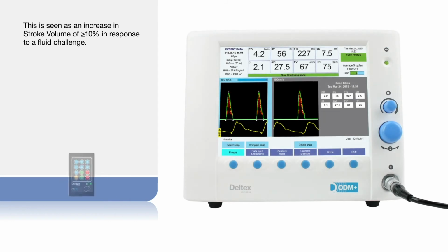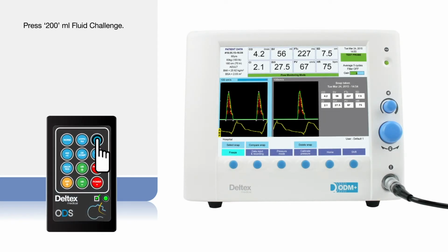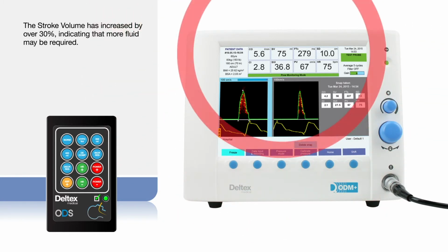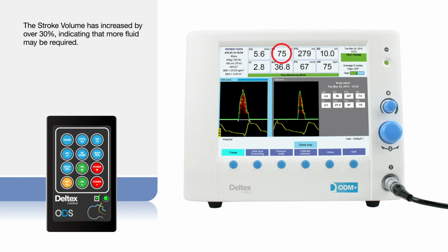On the simulator pad, press 200 milliliter fluid challenge. We can see here that the waveform has changed shape. The stroke volume has increased by over 30%, indicating that more fluid may be required.